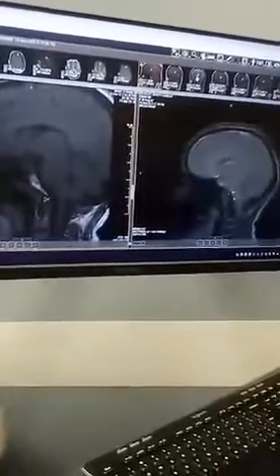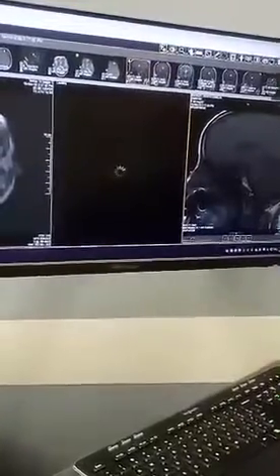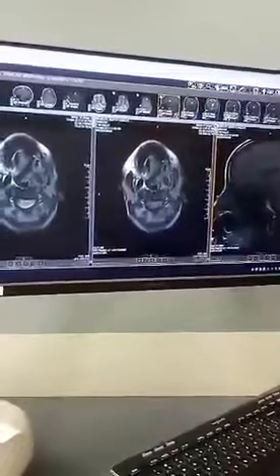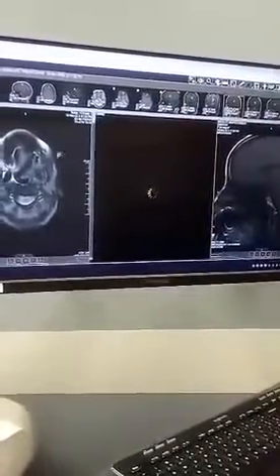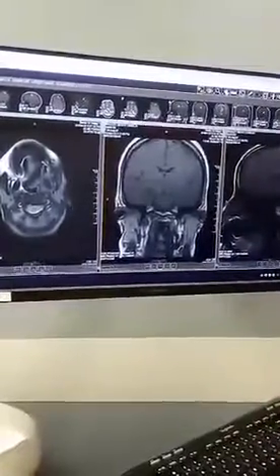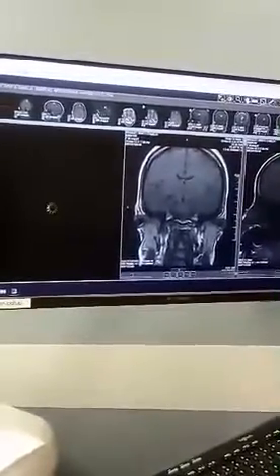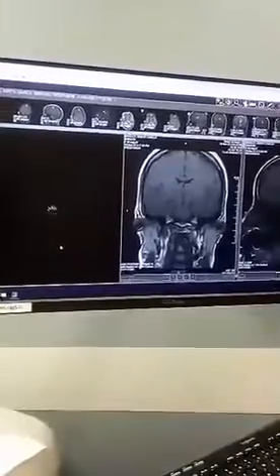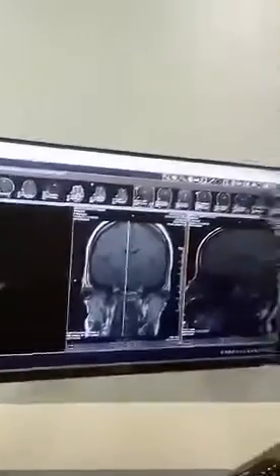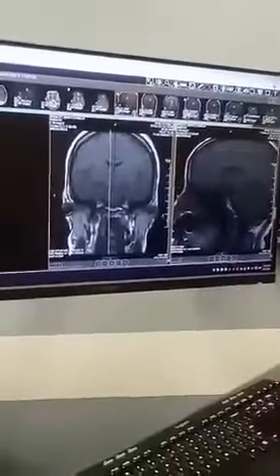And then, let's see, actually I'm going to put 3 pictures up here. So that's the side. This is the front. And then this one is going to be... come on. Anyway, while I'm waiting for that one to load, this is a side view. So this is as if we cut you open this way, looking in from the side.